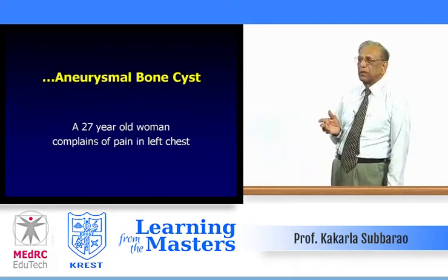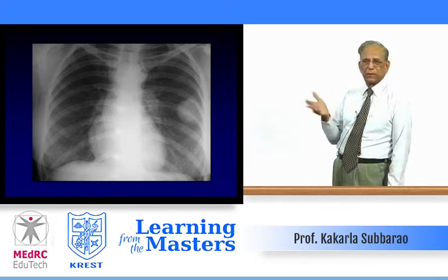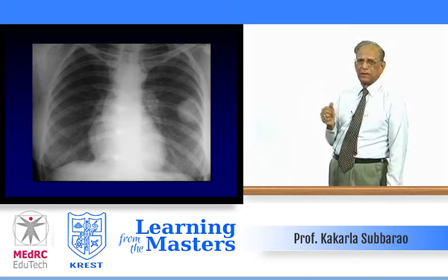27-year-old woman complains of pain in the left chest. Somehow, most of the films seem to be belonging to the women, but it is just incidental. Notice a rounded so-called coin shadow.